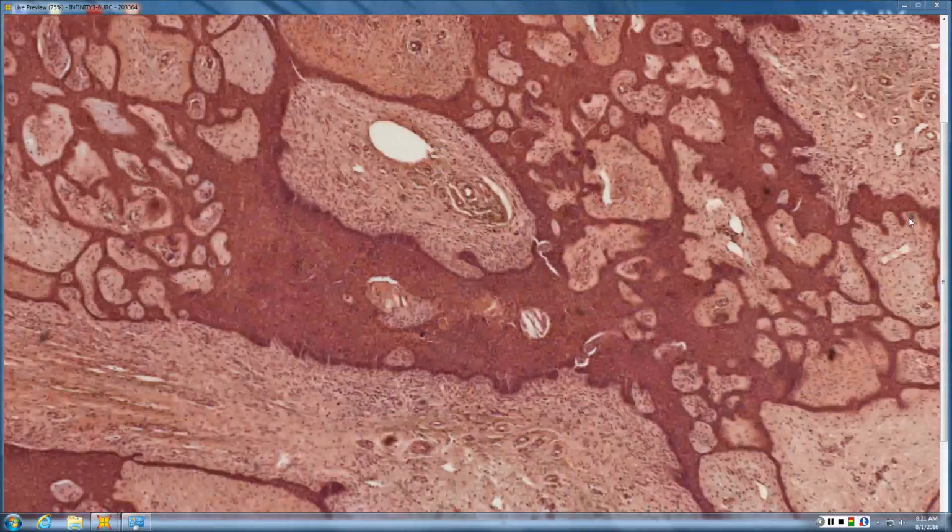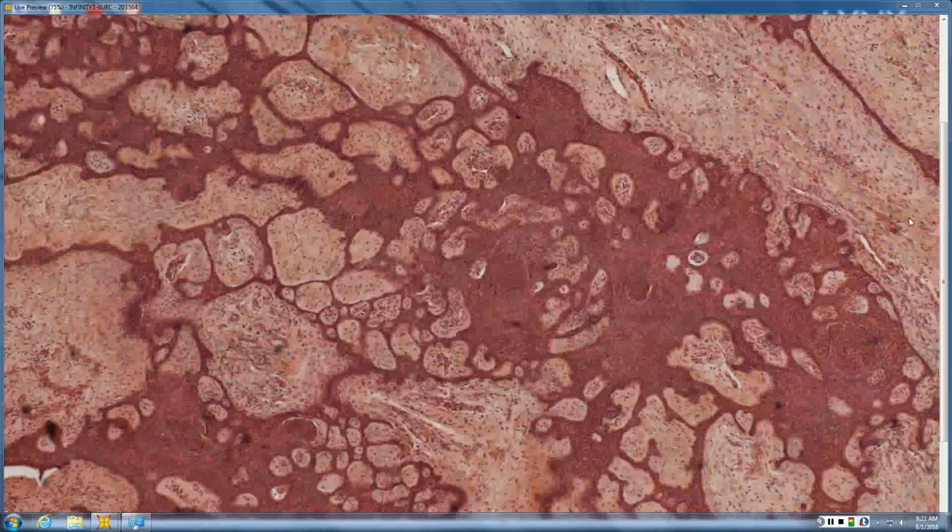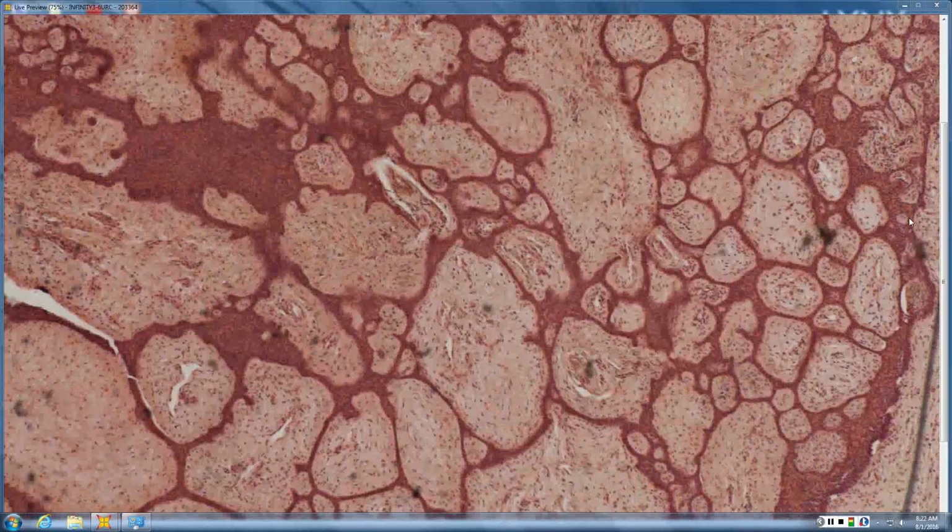So how about this one? Looks like a Pinkus tumor. So rather than fingers radiating outwards, these are an anastomosing net-like network that traps the stroma. So those are your two pink strand, blue bud tumors.